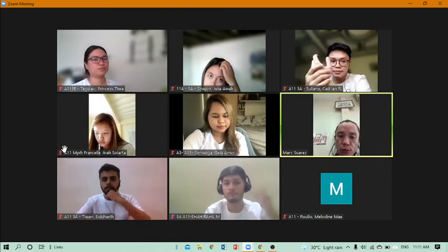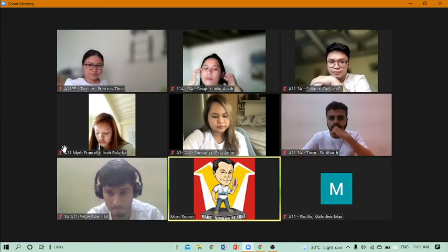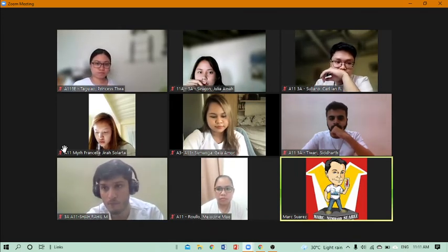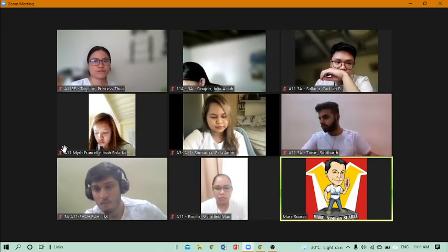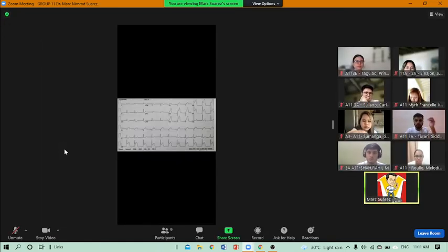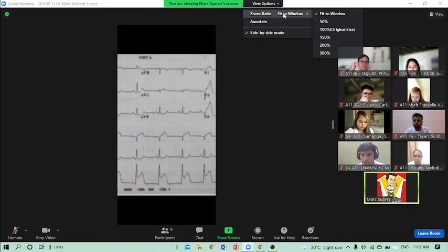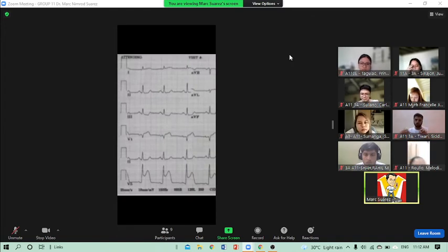Okay. So with the ECG, so this is the ECG. So we will try to correlate. This is the ECG. This one. Everybody sees this? Yes. Okay. So let us check first the axis. Oh, the axis is later. That's for Thursday.